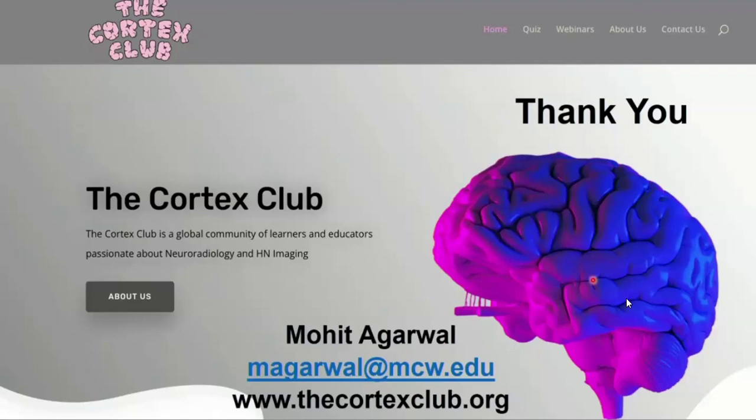Yeah, so one thing that has always helped me is to look at the first tumor image, because with tumor recurrence, the intensity of the primary tumor, how it enhances and what it looks like, resembles the recurrence itself. It's the same tumor that got left behind and is growing now. So looking at the very first image, unoperated, untreated, really gives me a sense of what that tumor looked like and how the recurrence looks. In terms of comparing the tissue, I think that is very useful.